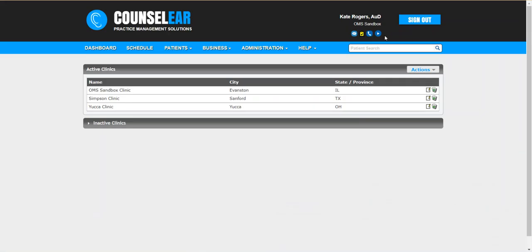As I mentioned, it's very quick and easy to activate telehealth through the Start Telehealth Session icon here. That's just your on-demand. You can do it right away. You also have the ability to schedule telehealth sessions.